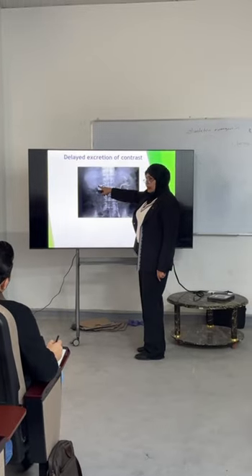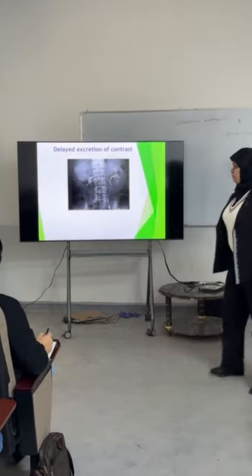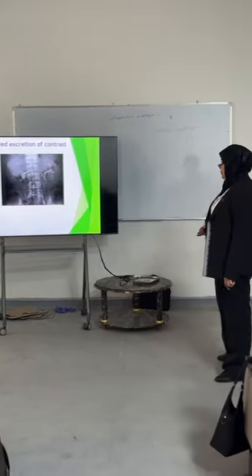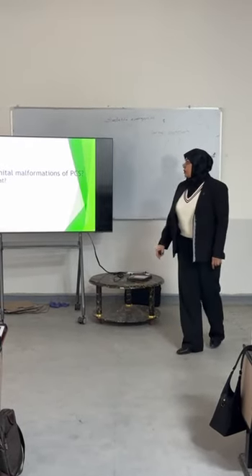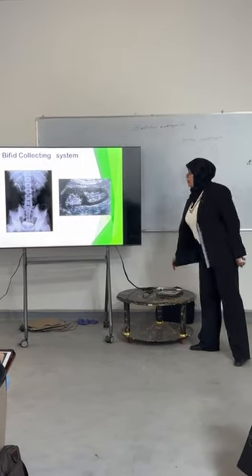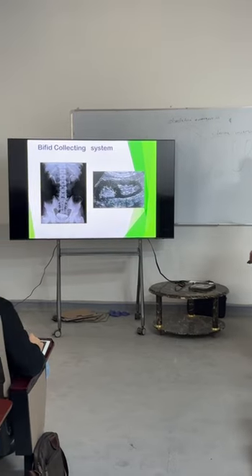Here, look for dilatation of the ureter. Some congenital anomaly of the pelvicalyceal system. Can you explain this?